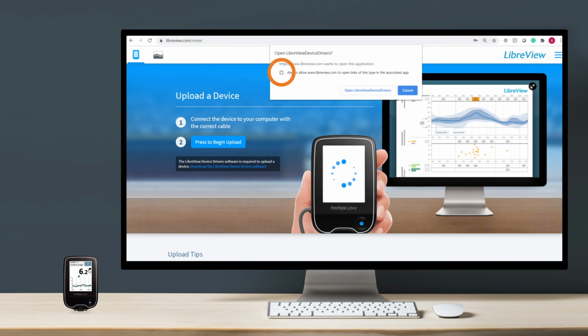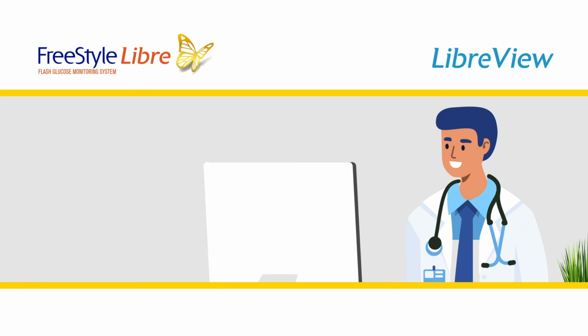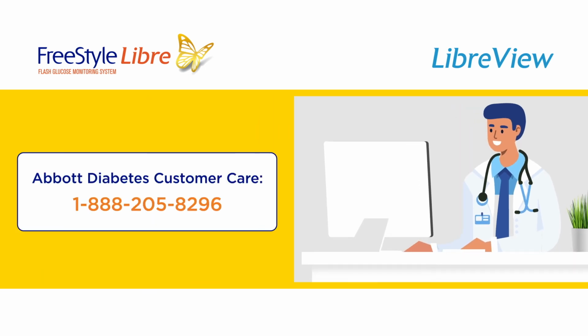If so, check the box to give the program browser access. There you go. Your healthcare provider can access your glucose readings for discussion at your next appointment. Just be sure to upload before the scheduled session. And if you forget any of the necessary steps, don't hesitate to replay this video or call customer care.